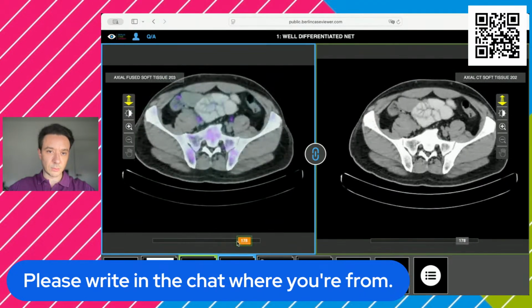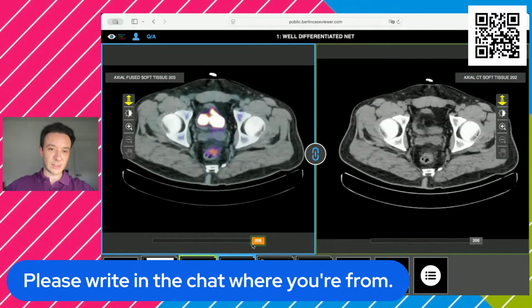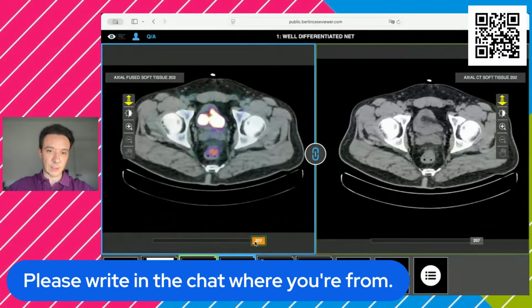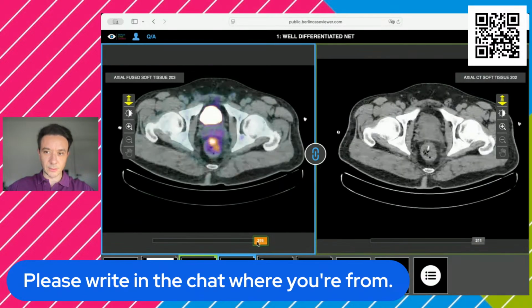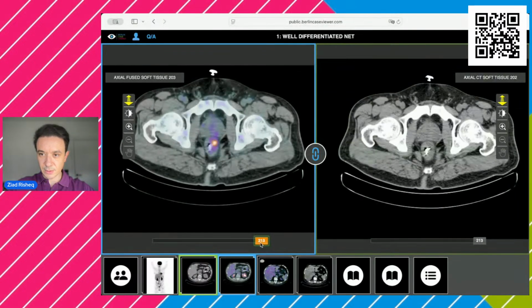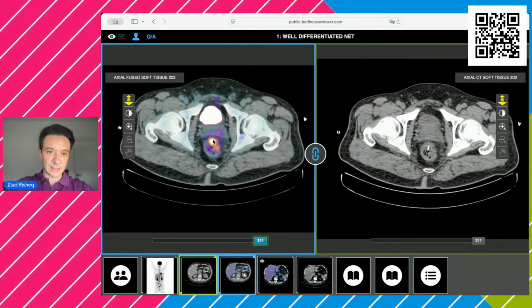And when we go down to the level of the rectum, at first glance, when I looked at this uptake over here, I just dismissed it as probably normal physiological uptake. But when you look very close, you can see on the CT part over here, there is a bit of fat infiltration. I think there were tiny subcentimetric pararectal lymph nodes. And when you look at the activity in this hotspot, it is not what we usually see in a physiological or inflammatory condition.